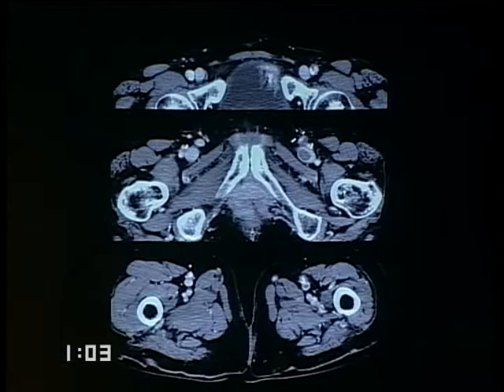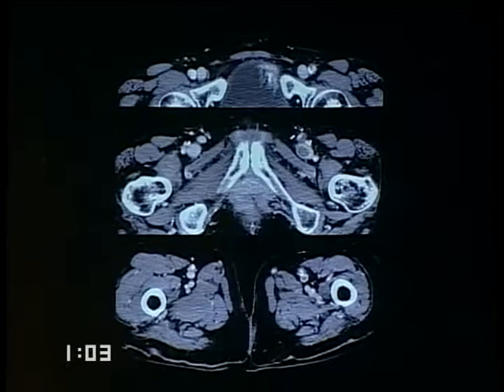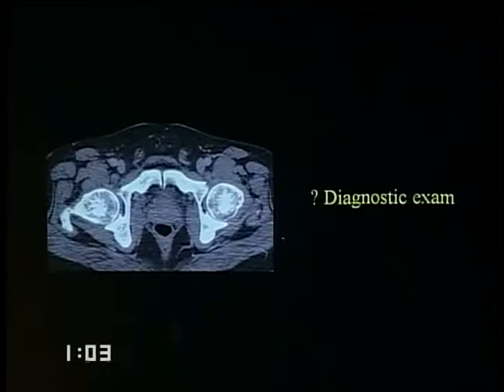And here's an example where we've achieved pretty good opacification of the veins, artery and vein at the level of the groin. Here we see a typical thrombus, partly outlined by contrast. The vein is distended. And here again, a very typical example of a thrombus. The commonest issue here tends to be, when is the exam diagnostic? Because it's impossible to predict the amount of opacification.